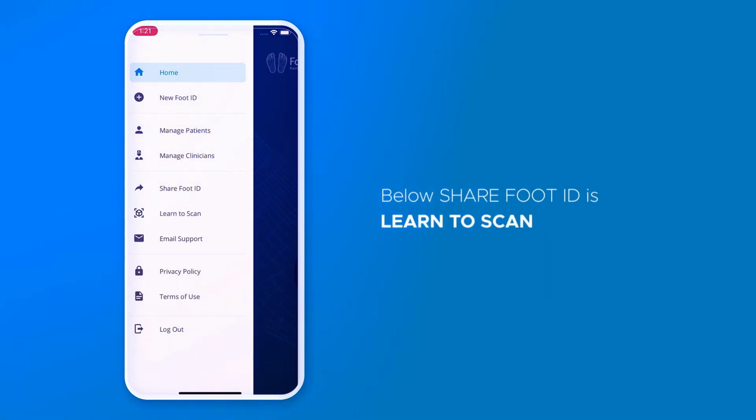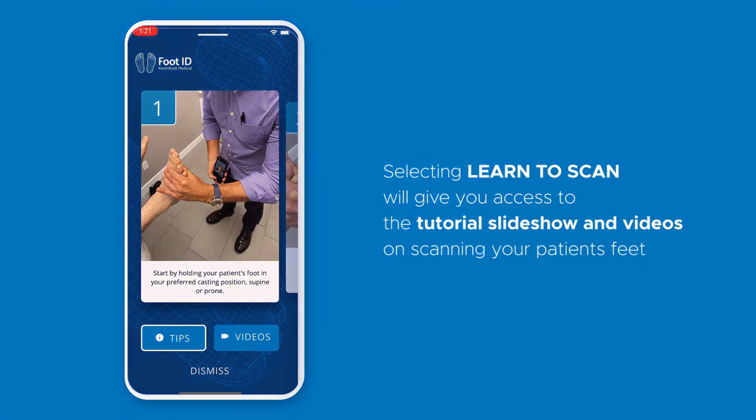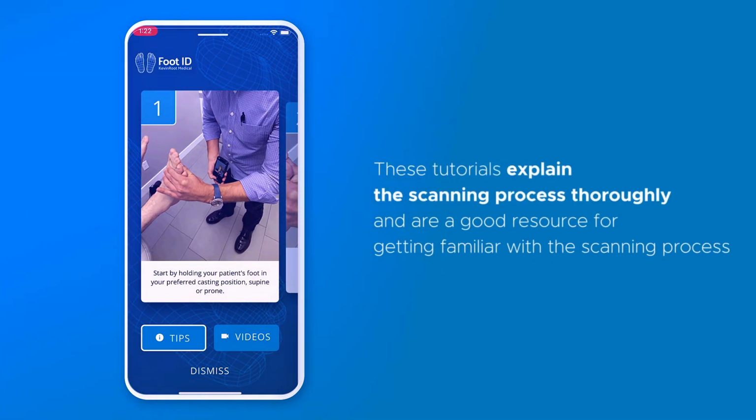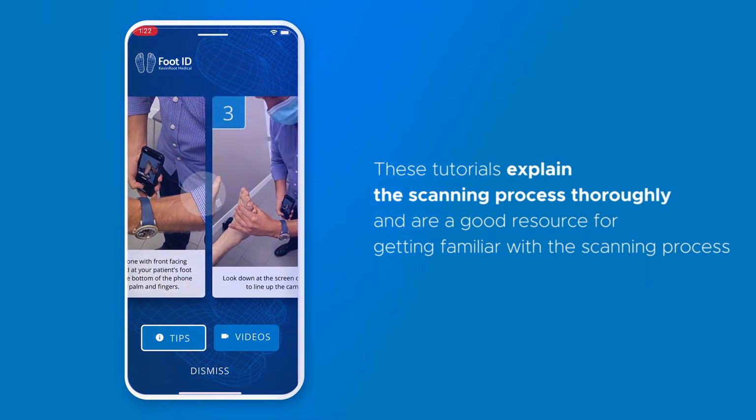Below Share Foot ID is Learn to Scan. Selecting Learn to Scan will give you access to the tutorial slideshow and videos on scanning your patient's feet. These tutorials explain the scanning process thoroughly and are a good resource for getting familiar with the scanning process.